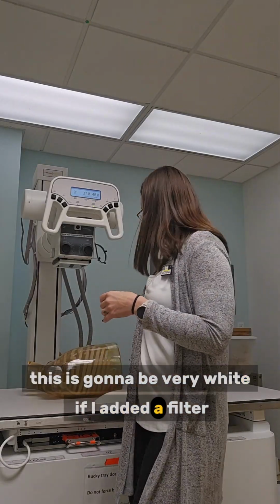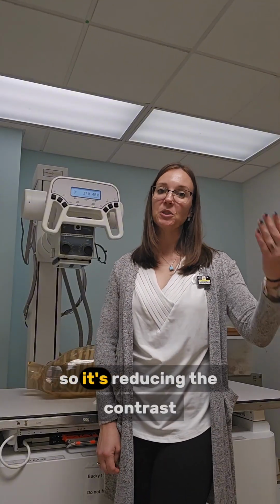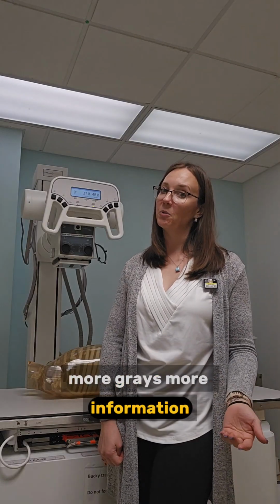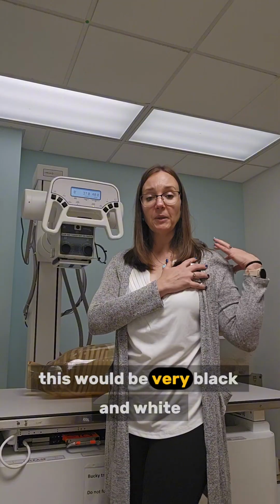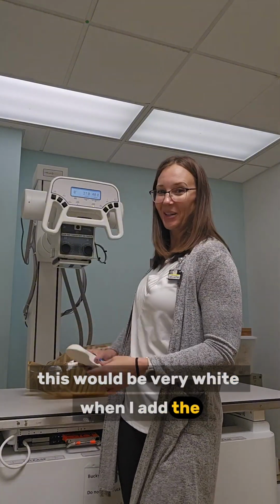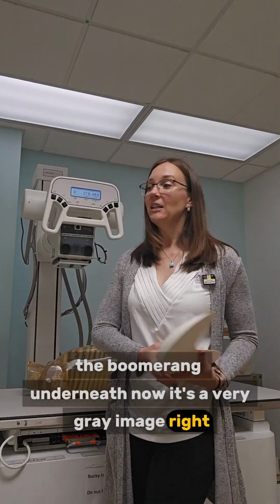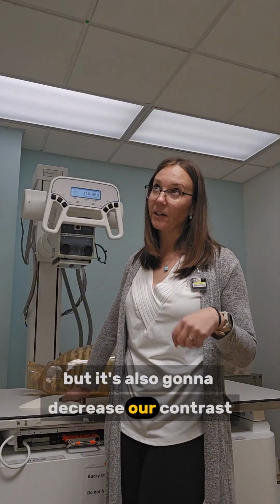If I added a filter right here, it's all going to be very gray, right? So it's reducing the contrast, creating a longer scale, more grays, more information. If I had my shoulder, this would be very black and white, this would be fried out black, this would be very white. When I add the boomerang underneath, now it's a very gray image, right? So it's going to decrease our IR exposure, but it's also going to decrease our contrast.